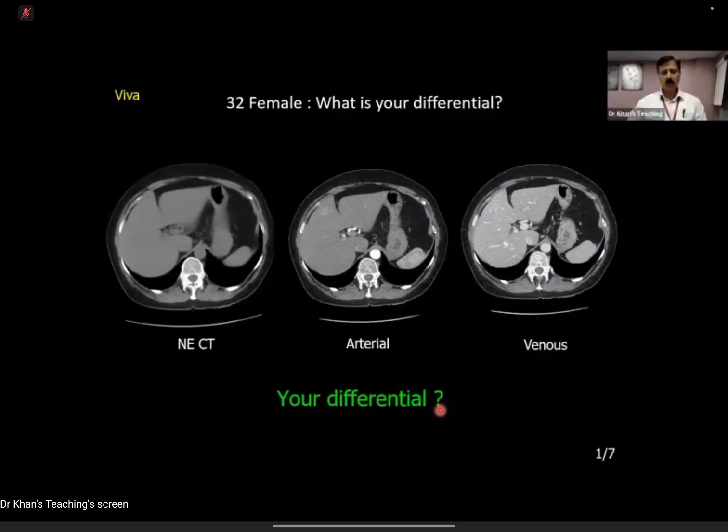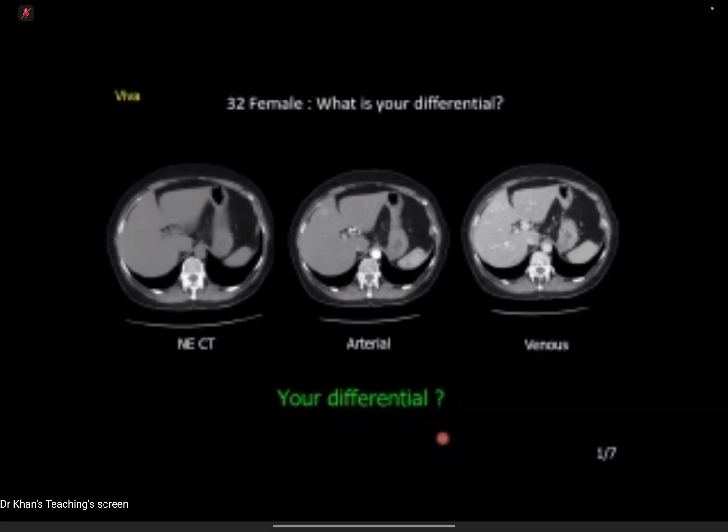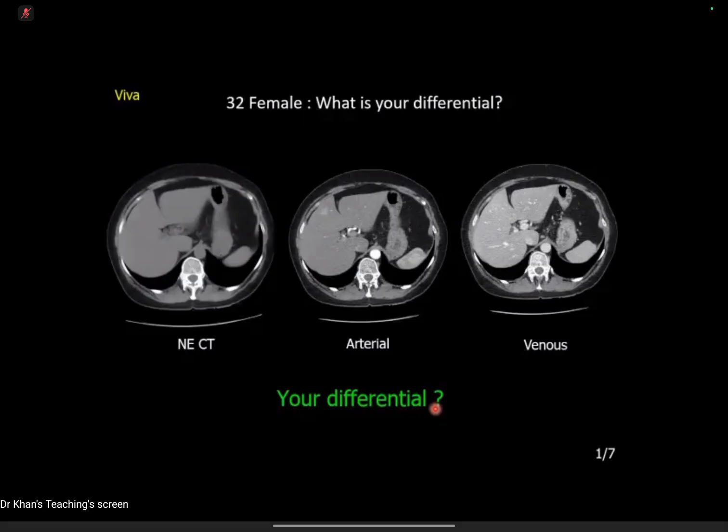Okay, so can it be something malignant? Can it be metastasis? It can, just looking at the age and the fact that it's a solitary and the liver's got a nice contour. There's no evidence of cirrhosis in the liver. The parenchyma appears unremarkable. So I'm thinking less along the lines of HCC or MET. And are you confident? You're using the word less? METs would be at the bottom of my differential.